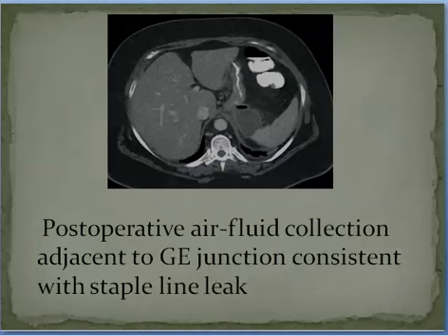Now, a postoperative air-fluid level collection adjacent to this. What is delineated here is the reconstructed stomach, the staple line, and this is an abscess, typically an abscess. Usually the abscess is adjacent to the spleen.